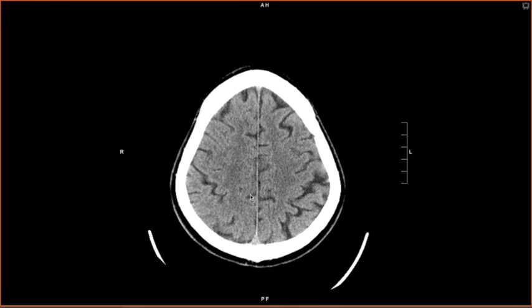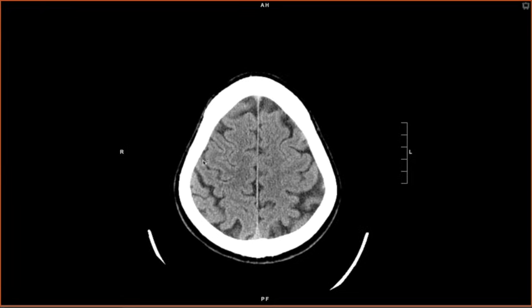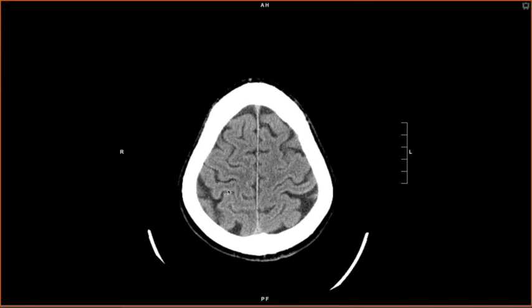Another way to find the central sulcus that's practical is looking for this in the midline just inferiorly. Call it moustache sign. It kind of looks like a mustache. These are the marginal sulci. If I scroll up, the sulcus anteriorly to that is going to be the central sulcus, and it is here as well. If you aren't going into radiology, don't worry too much about these details. Just know the basic lobes for now.